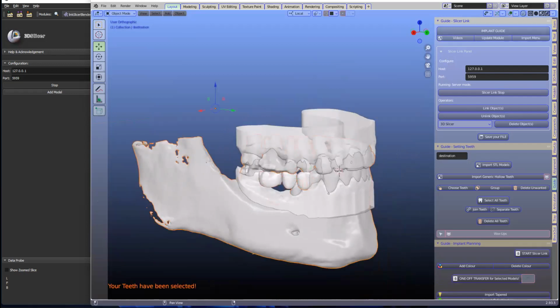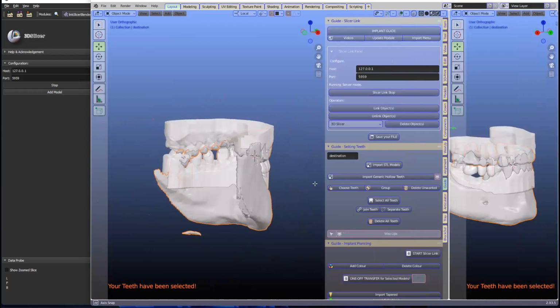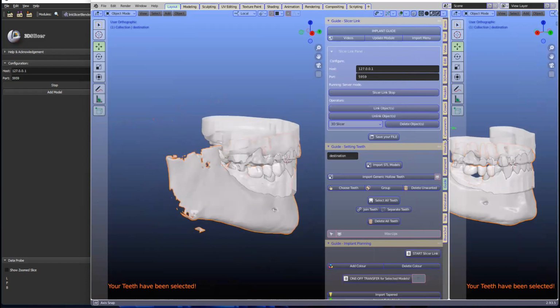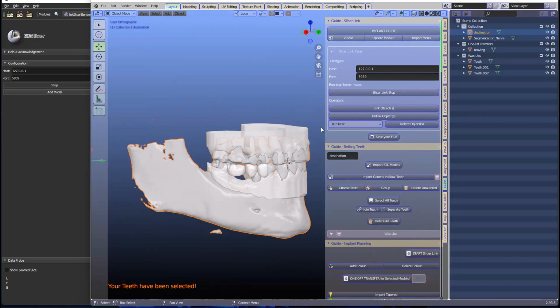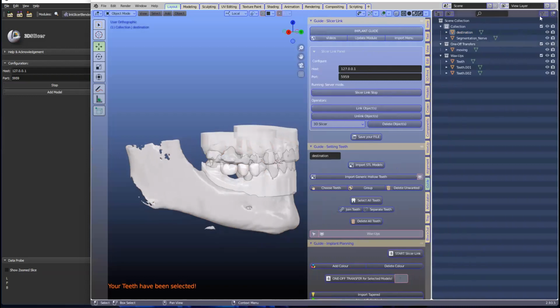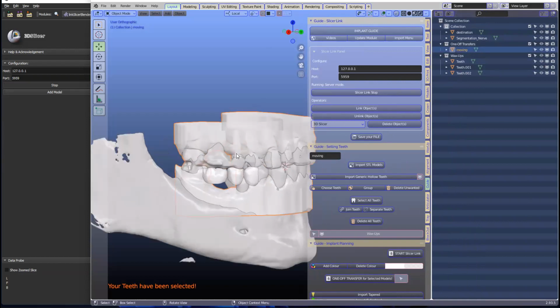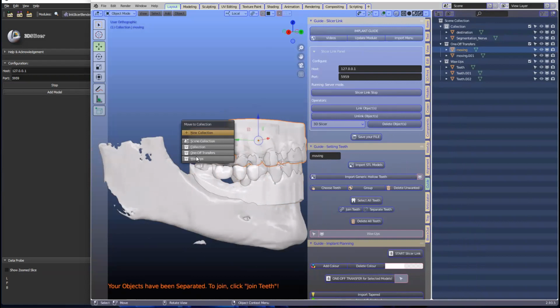Also, we are finished with this ICP model, although we could use it for demonstration of our implants, Wolfgang, when we put the implants in. Maybe put it in another collection. Yeah, I think so. Sometimes if you can't click on something, there is a purpose behind that. Like I'm trying to click on this model and it's not working, and that's because it shields the transfer of the models. So okay, we will just unlink that, separate, and I'm going to take this and move it into a hidden collection.